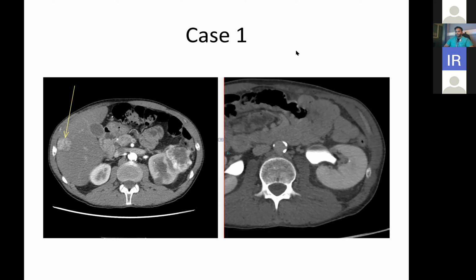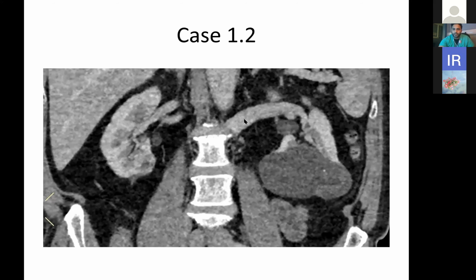Yeah, on the basis of CT. On CT, okay, fine. So if I just show you, for example, this case right here, can you see that this is quite low in attenuation and it's relatively homogeneous? There's no internal complexity to it. There's no solid components to it.